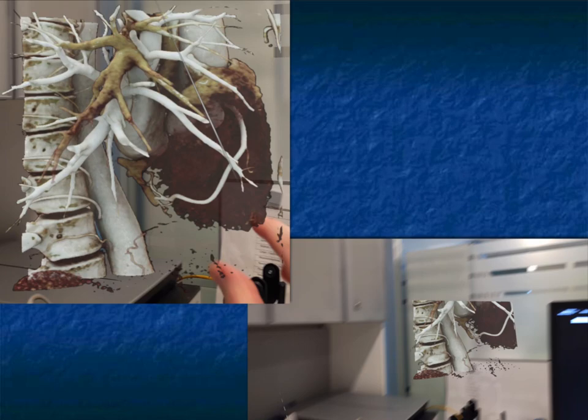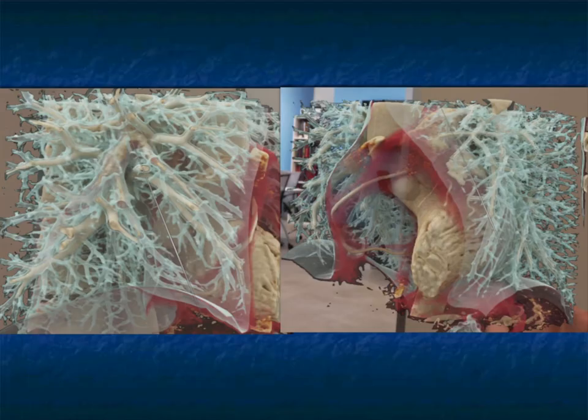Here's an example of cardiac imaging, looking at the pulmonary vasculature. You can see again, it's projected against the cabinets in my office. So it's good to do it, I've learned, against a clear wall. So when you take pictures, at least you don't see a whole lot of what's going on.